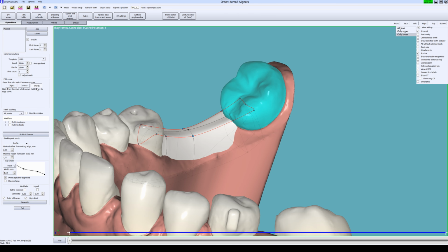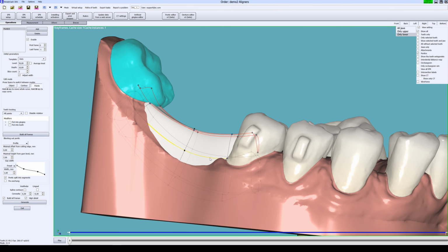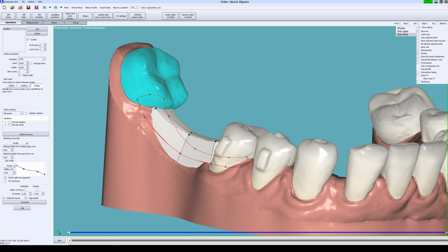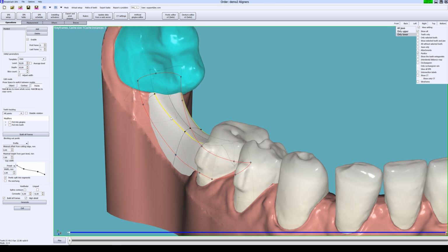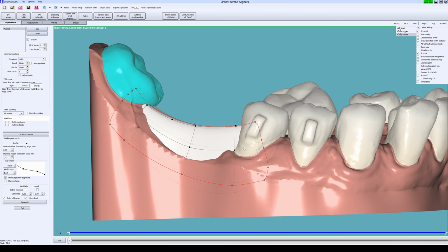To copy a contour, I hold the button D, with the left mouse button select a vertex and move it. I can move new vertices that were created with a new contour. To add an additional vertex, hold Ctrl and click the left mouse button. Be sure that the current active mode is points in the left side menu. Hold Shift and click the left mouse button to remove a useless vertex.